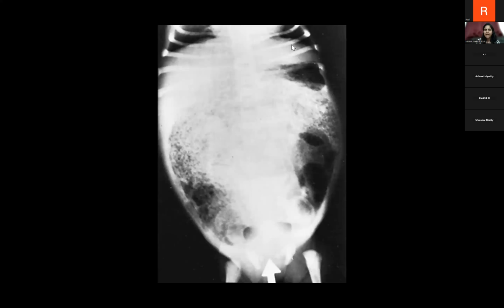Okay, one more question I have. This is commonly seen in which condition? Yes, CF, cystic fibrosis. Very good, very good. Who answered it first? Vrinda. Vrinda answered it first. Very good. This is seen in cystic fibrosis.